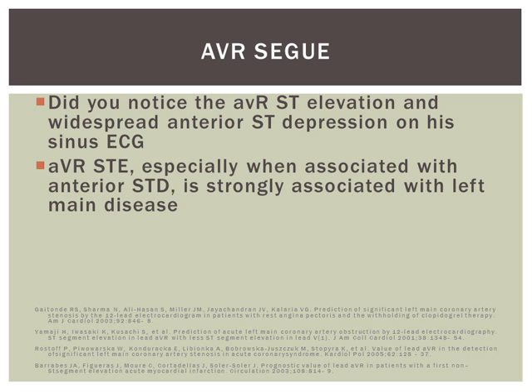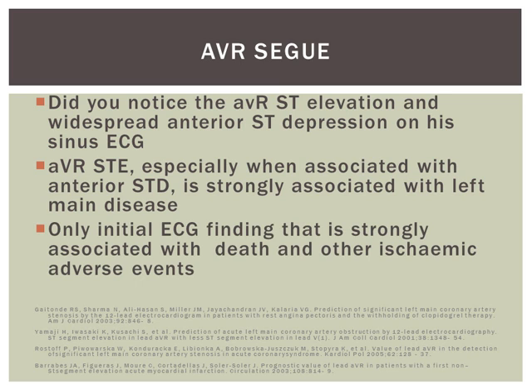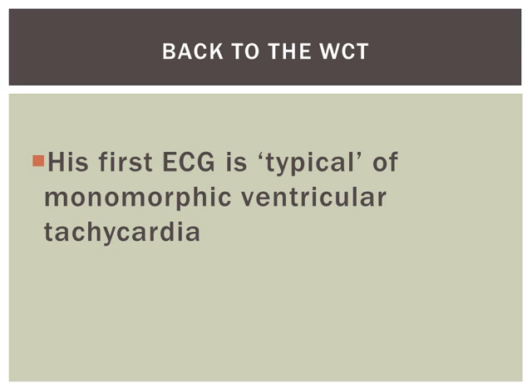The aVR ST elevation pattern has been well known for quite a few years, but if you're not aware of it, you need to see ST elevation in aVR which is greater than ST elevation in V1, and you should also see anterior and sometimes lateral ST depression as well.